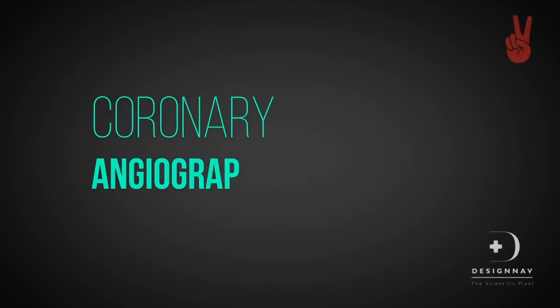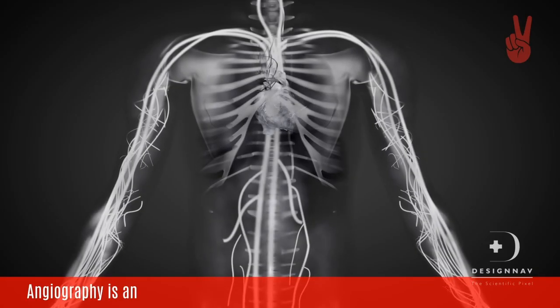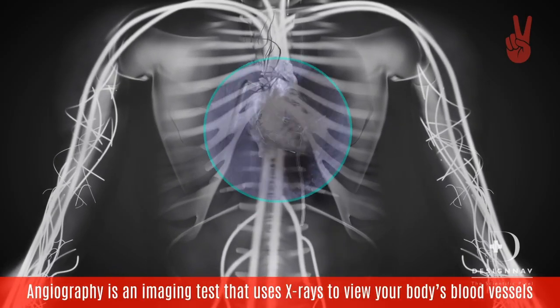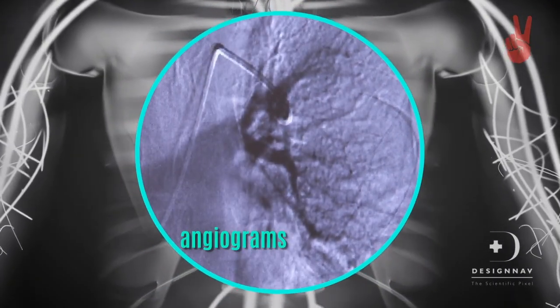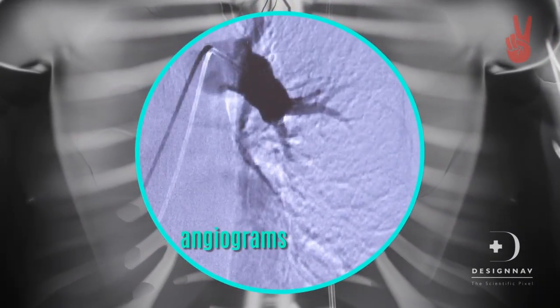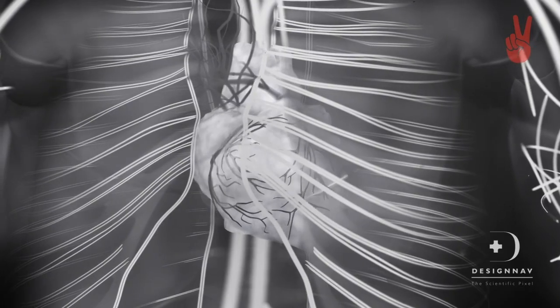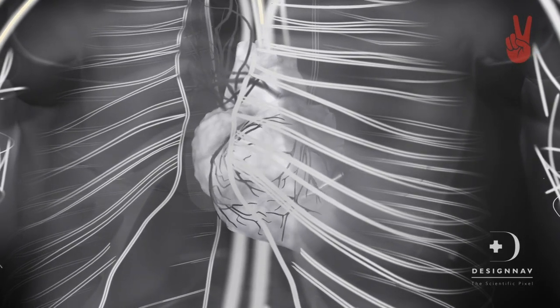Coronary Angiography. Angiography is an imaging test that uses X-rays to view your body's blood vessels. The X-rays provided by an angiography are called angiograms. A coronary angiogram is an X-ray of the arteries in the heart.